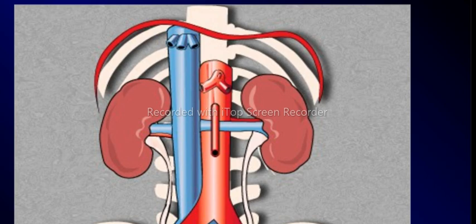If we were to remove still the pancreas and spleen, then the most posterior organs, there we have in the retroperitoneum, these kidneys here. This is the right kidney, left kidney, and their draining and supplying vessels.